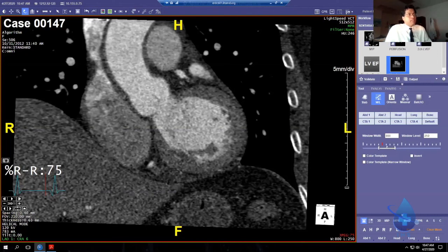If you put it in the middle of the lung, you see minus 669. If you put it on the bone, the ribs, bone here on the edge, you get 795. But if you put it in the bone marrow inside the rib, you get 26, which is soft, mushy bone marrow inside the rib. So what is this scale we're talking about of Hounsfield units?